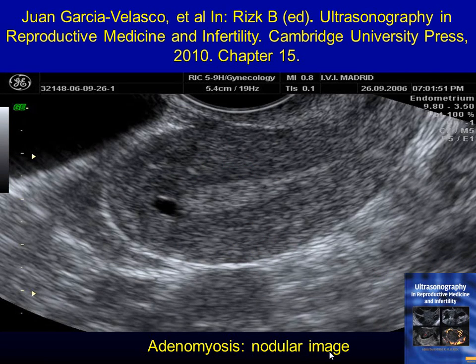This patient here, you will look at it, you want to say, well, this is an endometrial cyst, or some other pathology. This is adenomyosis. So what is adenomyosis? It is an extension of the endometrial glands into the muscle wall of the uterus. It's a totally different disease from endometriosis. With endometriosis, you look in the pelvis with your laparoscope, you find nodules here and there. Here there is nothing to do with endometriosis externally. So they call it endometriosis interna, one of the old names, but basically it's a cyst here.